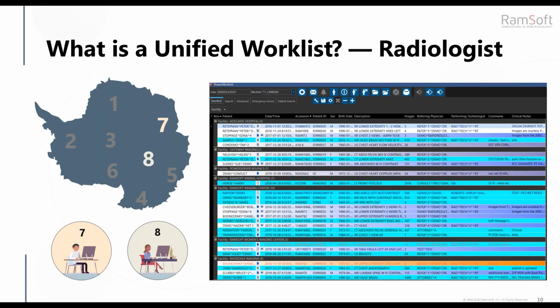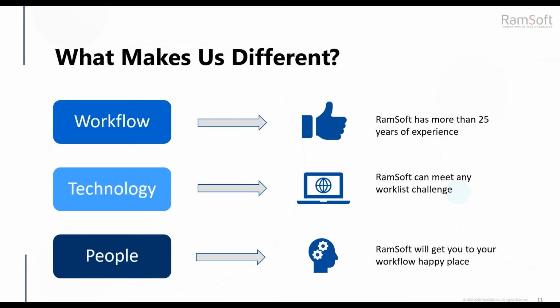For radiologists, radiologists love this feature as they can work from a single list, configured however they please, by study type, modality, location, etc. And this is personalized, okay, for everybody really. It doesn't have to be a global list. It can be a global list. It can be a personalized list. Radiologists love to have their own personalized list. And also keep in mind, on the radiologist work list, anytime a stat exam comes through, it always floats to the top regardless of the way it's configured.